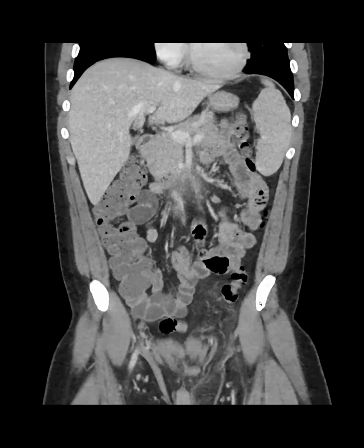And we think that this is in the rectal wall? Yes, I think so, because up high it looks fine right here, right? Up by the mid base is fine. Right, but even in the mid part of it, you're saying it's in the rectal wall, dissecting the layers of the wall. Yes, that's what I think. Okay. What do you all think?